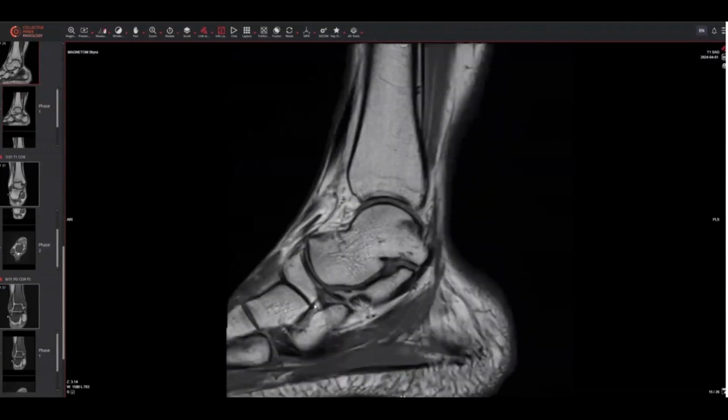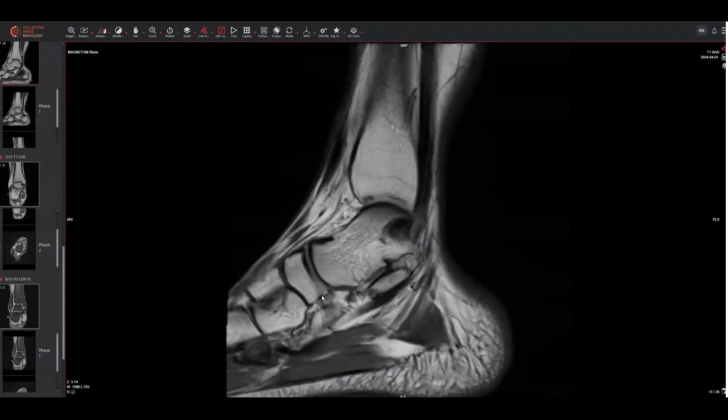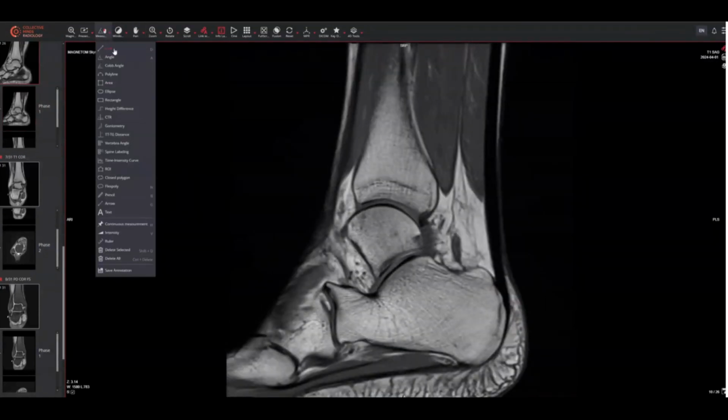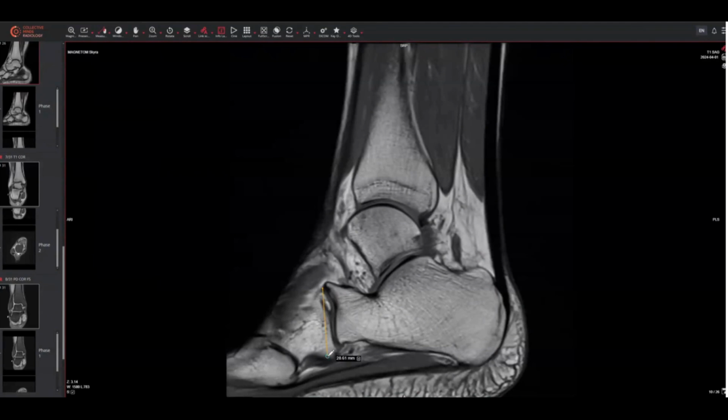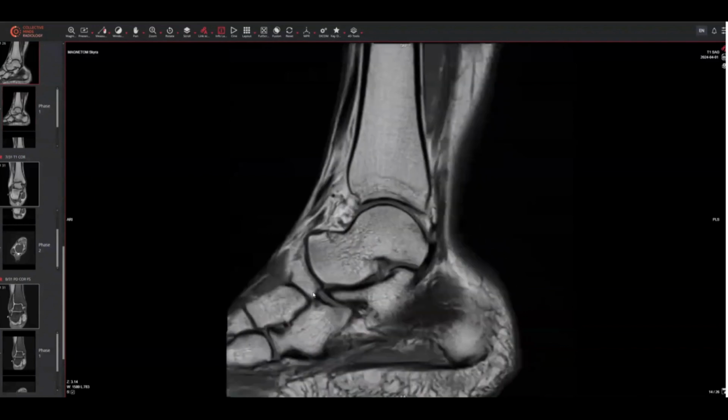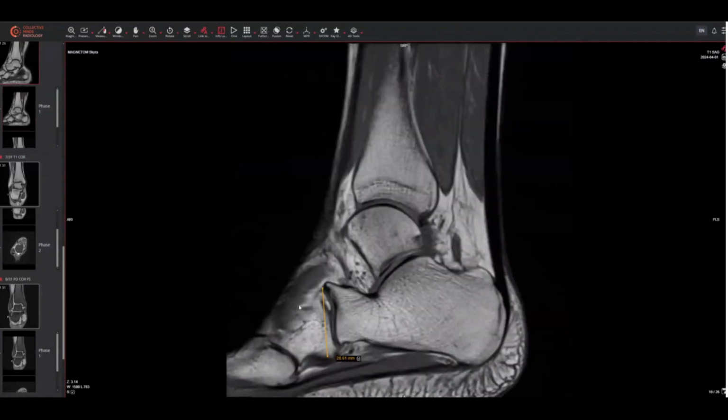The next thing I want to understand is how my navicular covers my cuboid. So that's another thing that I can use to understand what my angles are. So just looking at the coverage of the cuboid, I want to understand the entire articular length of that surface, drop a line where my navicular is, and then I can understand to what degree I'm actually bisecting that. 50%, if I'm greater than 50% covered, that's a case of planus. If I'm less than 50% covered, this can be a sign of cavus.